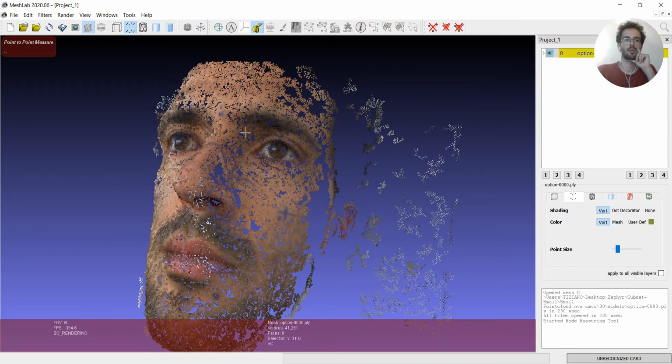We can measure from this dot, if you can see it on my face, and this other dot here, which are the 2 points I've taken to make the scaling part. So as you can see in this layer editor, if you don't see this part of the interface, you just switch it on like this.